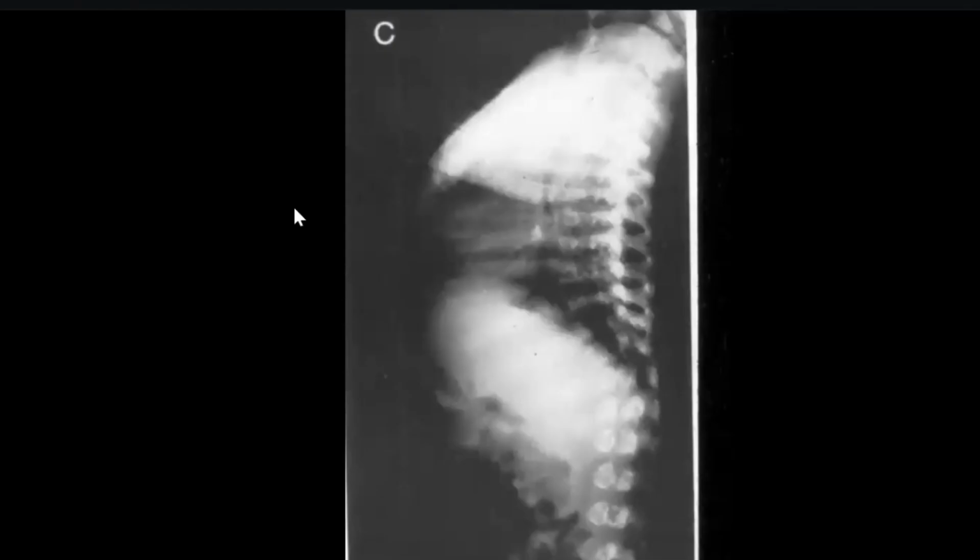On the lateral radiograph of the thoracic and lumbar spine, I can appreciate reduction in the height of the vertebral body as well as antero-inferior vertebral body beaking. The vertebral shape is deformed and there is shortening as well as deformity of the entire vertebral spine. So I would like to see the hand X-ray as well to further conclude my findings.